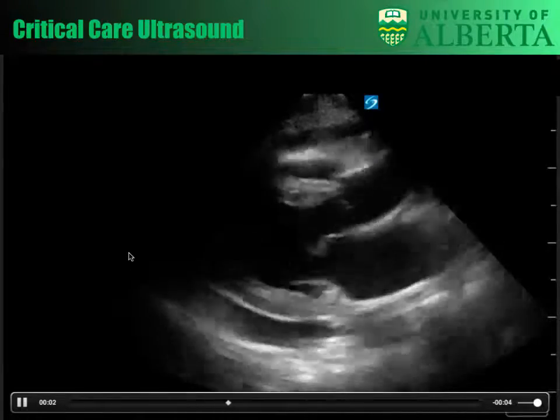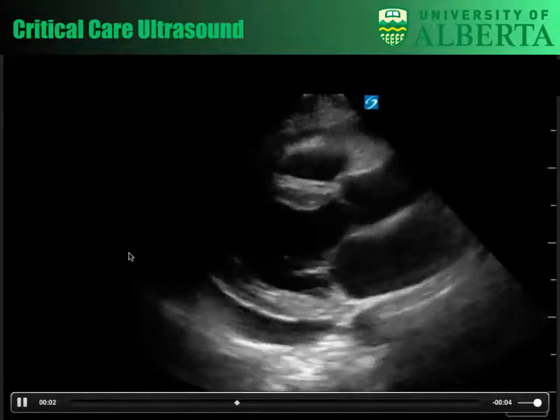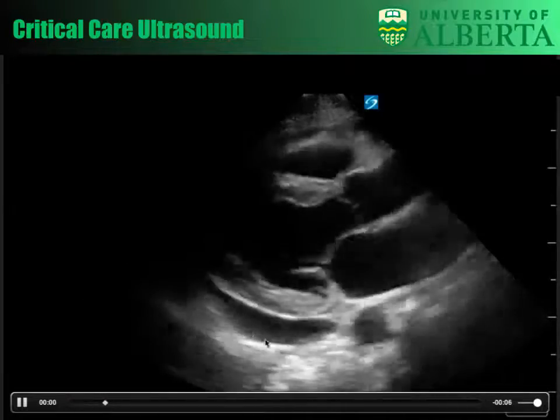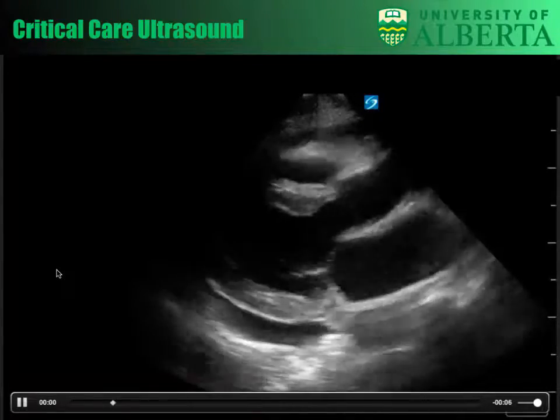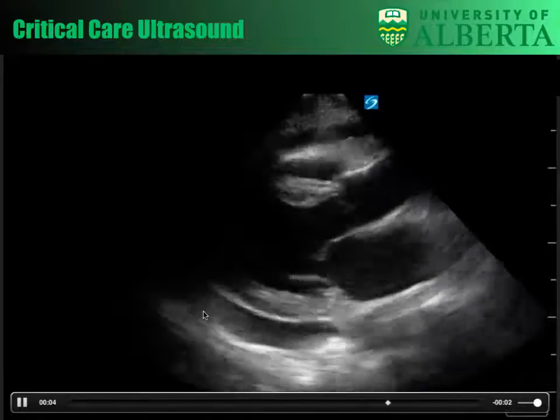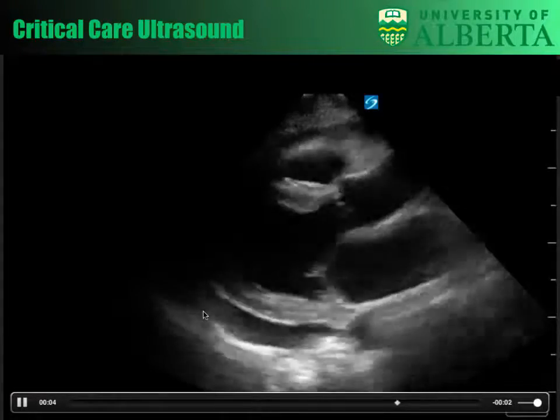If we want to get exact numbers and precision, we can talk with our colleagues in cardiology, but the point is what you can determine at the bedside from the images you have. Now, determining size, it's probably small to moderate, but again, you want some more views to really build up that understanding. Because if you didn't see this and you just saw this posterior component, but you saw it nowhere else, it's hard to say exactly what the relevance of that is.